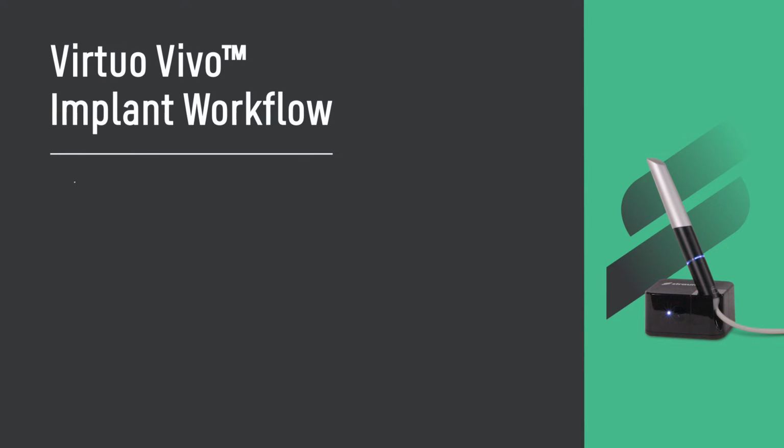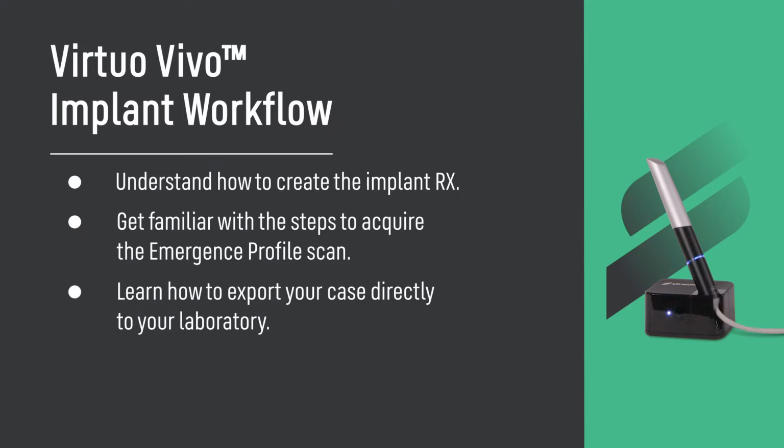Virtuo Vivo implant workflow. Understand how to create the implant prescription. Get familiar with the steps to acquire the Emergence profile scan. Learn how to export your case directly to your laboratory.